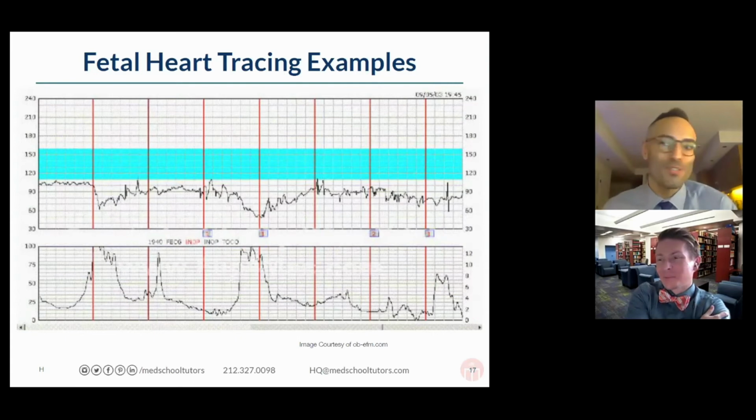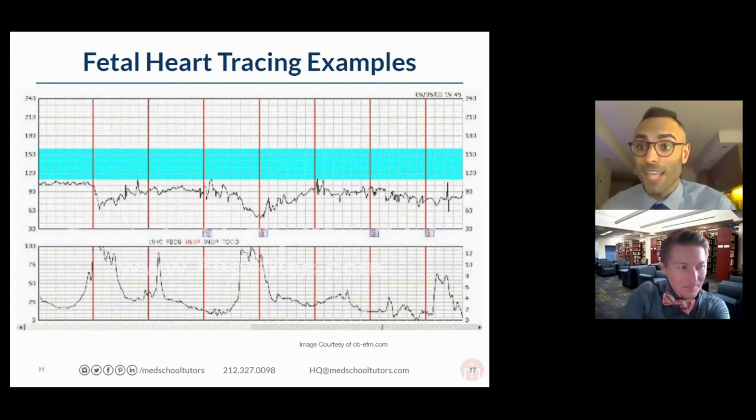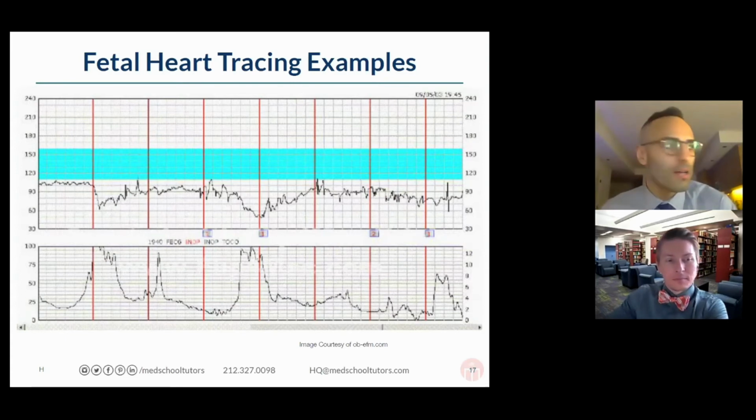Sometimes you can actually, this is a very rare scenario, but congenital heart block secondary to SLE can cause sustained fetal bradycardia. What are some other more common causes of fetal bradycardia? I'll leave it to everybody. And yeah, you got the antibodies right. Wow, good job. It's anti-SSA and anti-SSB, Ro and La. What are some more common? Okay, hypothyroidism, Mario Mikel. What else?